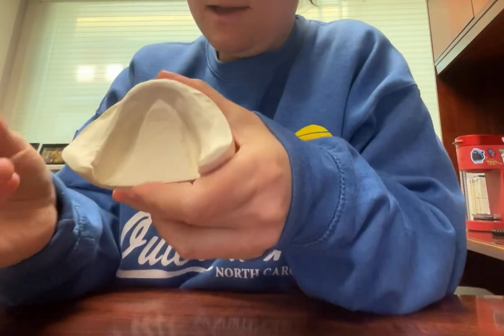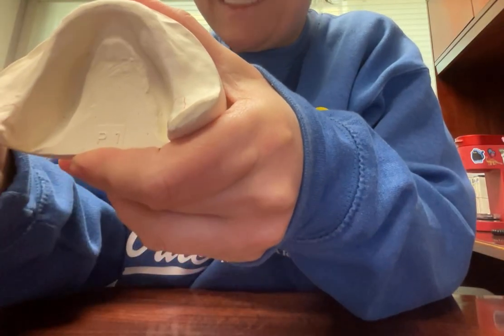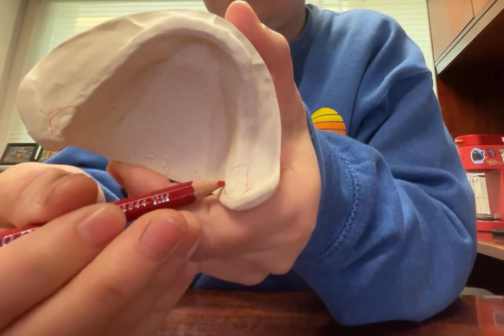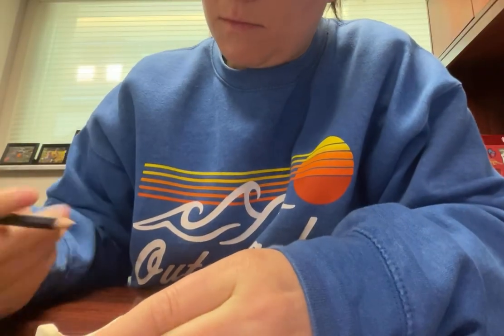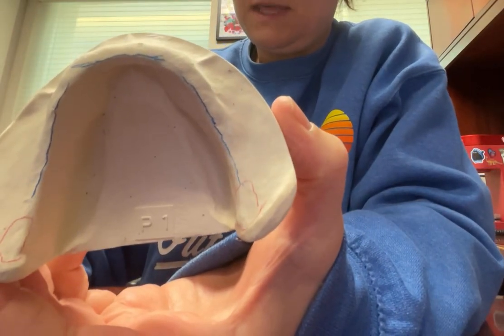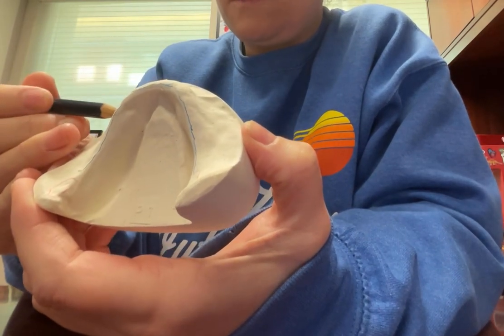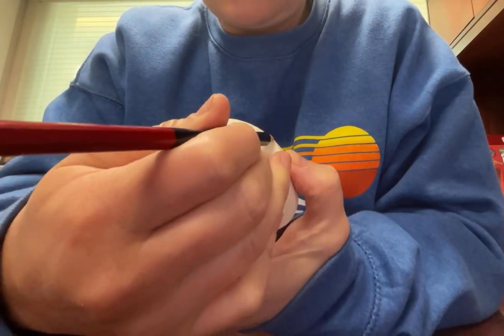On the mandibular, you circle your retromolar pads. So we have that one highlighted there and that one highlighted there. And now we're just going to do the same crest of the ridge lines. So I'm going to mark a line going across the mandibular crest of the ridge in the posterior and across the anterior crest of the ridge. So we end up with something like this. And then you can use a ruler, or you can just carry it across with your pencil and mark that on your land area.